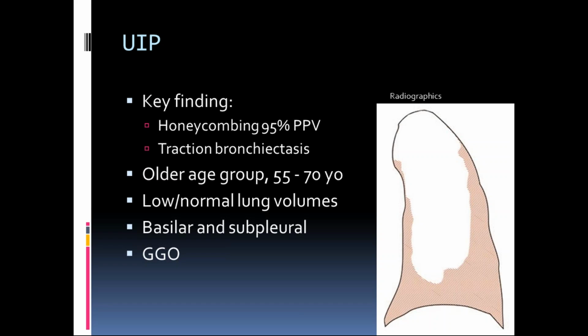The lung volumes can vary a little bit. Typically with fibrosis, you're going to have a shrinking or lower lung volume, but sometimes you can actually have a pathologically normal lung volume. The reason I say it's pathologic is because you have the normal shrinking of the lung with the fibrosis, but you also have expansion of the lung with concomitant emphysematous changes, which is actually a new entity in the high-res literature that I won't go into detail with because it's kind of new, and that's just the combined pulmonary emphysema and fibrosis picture.